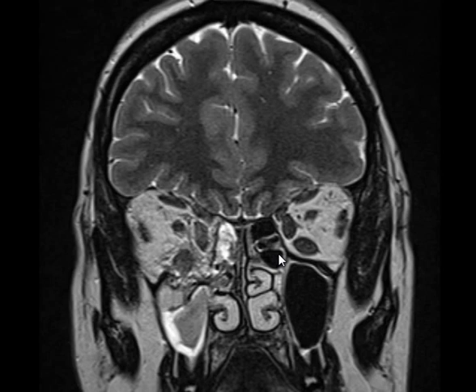So where's the inferior rectus? Point to it for me. Okay. Is it herniating into the sinus or not? Yes. Good. What about the medial rectus? Is it herniating into the ethmoidal cells or not? No. I don't see herniation. Compare with the other side.